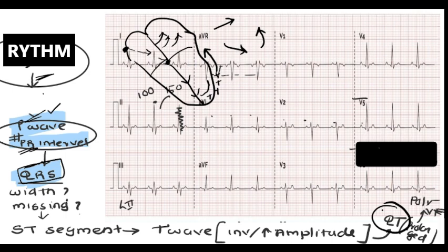After looking at the T wave, the next priority is very important: QT. The QT interval, from the start of Q to the end of the T wave, is called QT. The QT interval is important because a prolonged QT interval can cause a type of arrhythmia called polymorphous ventricular tachycardia, and some drugs can cause prolonged QT. People taking those drugs are at increased risk of having polymorphous ventricular tachycardia. So yeah, that's how we read an ECG.